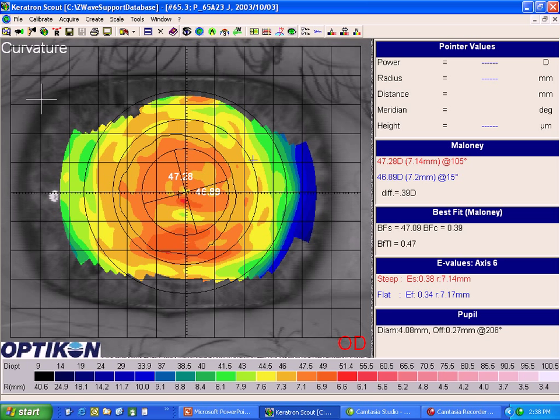In this case, I would be thinking I'm using a gas permeable lens to fit this patient, and one thing that I would conclude just looking at the quality of the data here is that this lens will most likely not ride high. If anything, it will probably center or ride a little bit low, and she's got pretty tight lids and a pretty small eye, so I better keep my lens small and thin. Just looking at the steepness and the asymmetry and the qualities that come from this map, that's my intuition of how a gas perm lens will fit on this particular cornea.